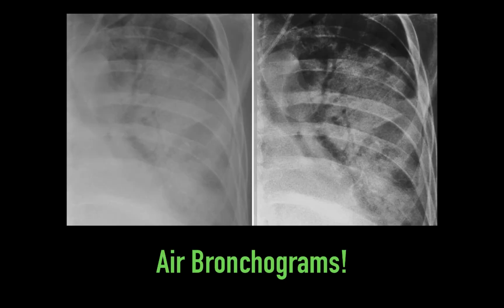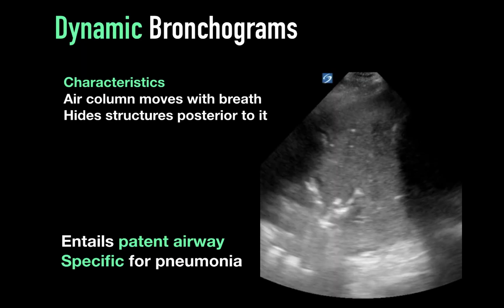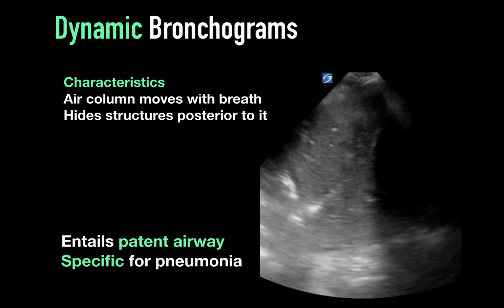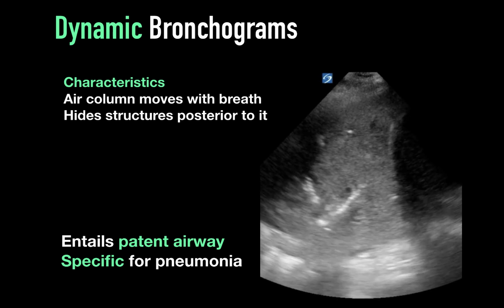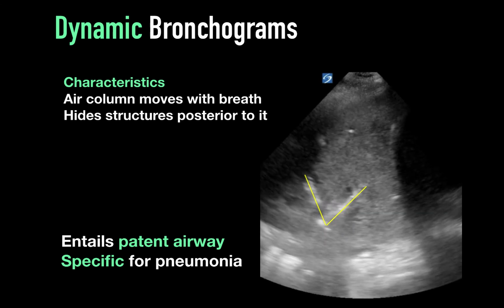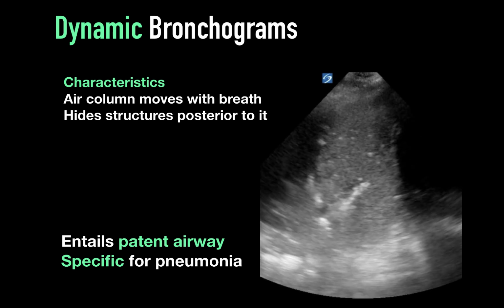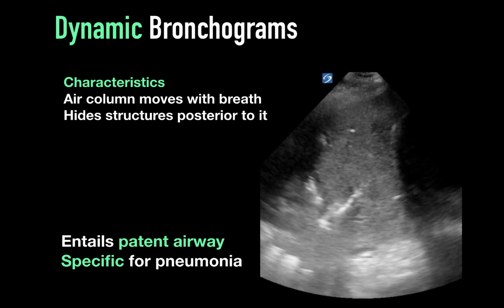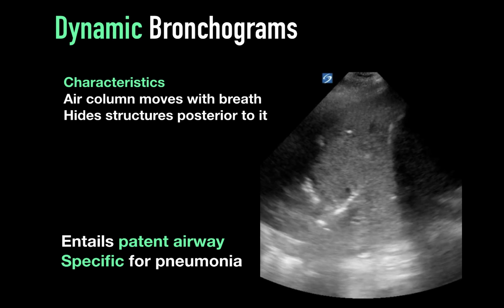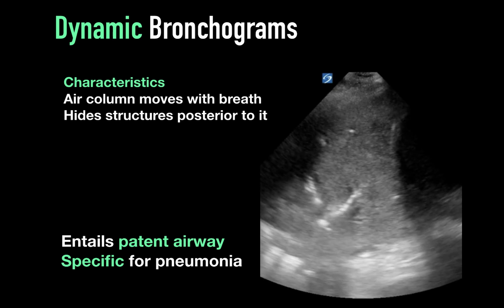In one case, for example, on X-ray, we may actually see air bronchograms. These can actually be occasionally displayed on ultrasound in select patients. In this example, we see very heavy consolidation, and we see these branching, scintillating, hyperechoic artifacts here, which is actually air-filled bronchioles. And these are air columns that are moving with breathing. This really is highly specific for pneumonia or infective consolidation.